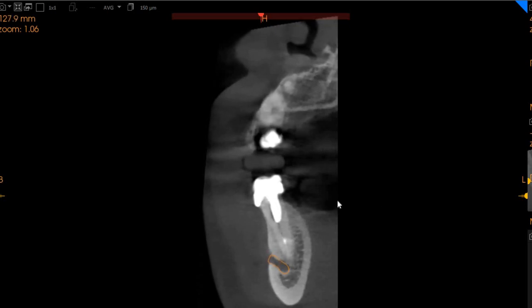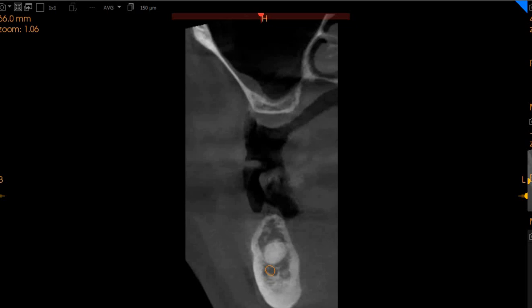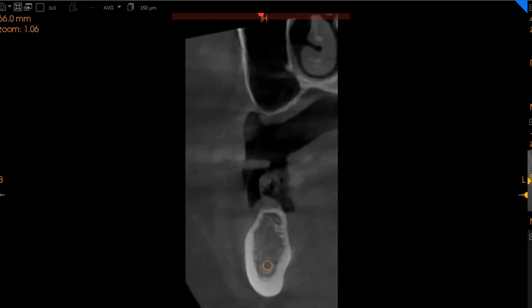The endodontic treatment is not very adequate, but there are no radiolucencies, and the tooth is sitting right above the inferior, the mental nerve. This is something to be kept in mind. The only area where we can place implants are the lower right segment.